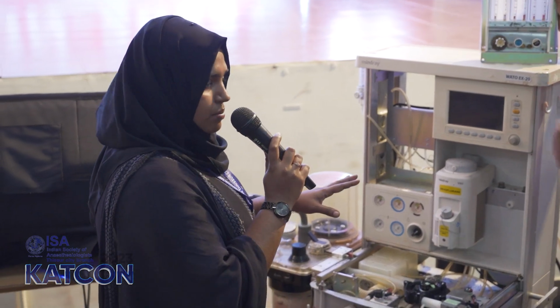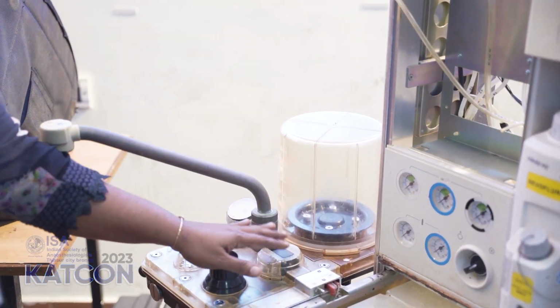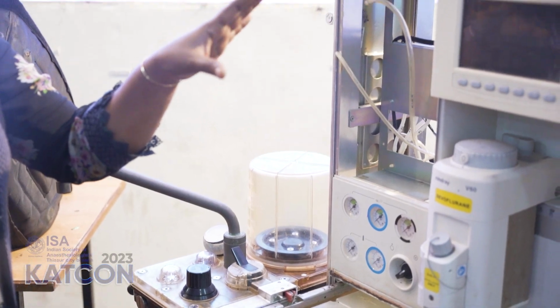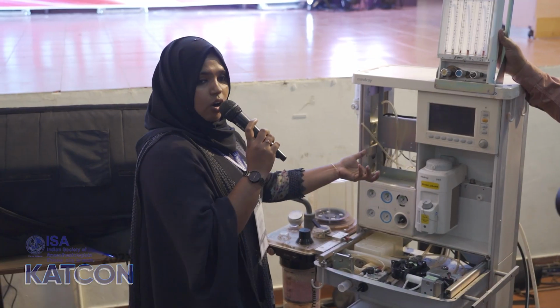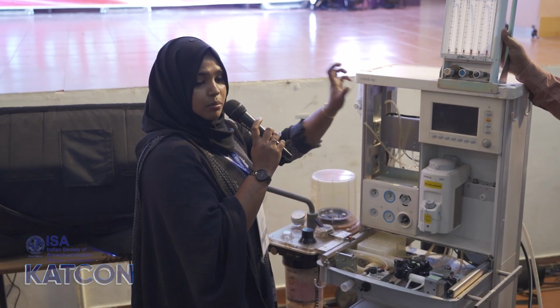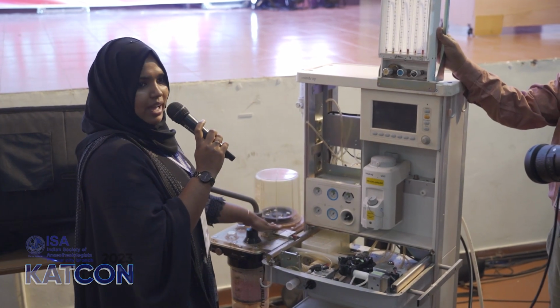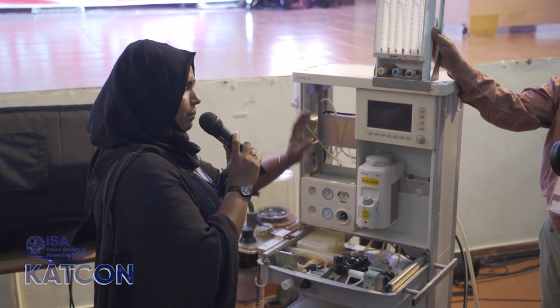And the other thing is whether the ventilator is working or not, and also the manual breathing circuit should be working. We will check through the breathing circuits, and all the newer machines have automatic checklists. When we turn on the machine itself, it will show some cautions or clues to check the machine, how to check, how to put in the bellows or the bag. Then according to that, we can check the machines. Then the next comes vaporizers.